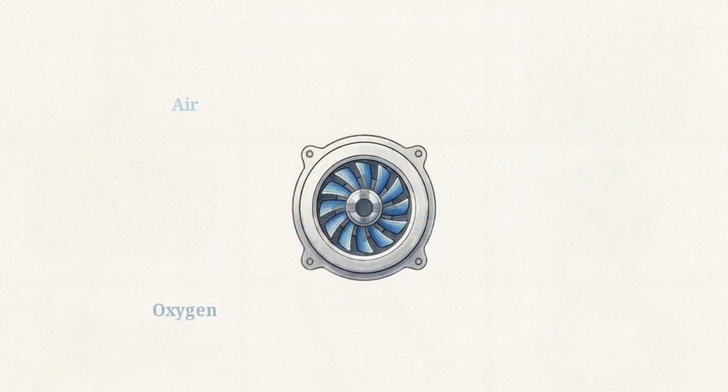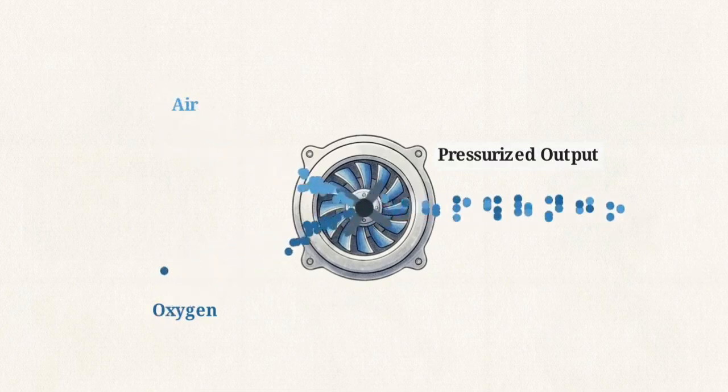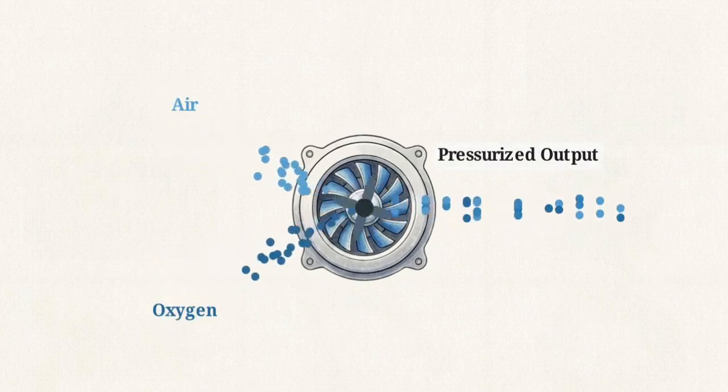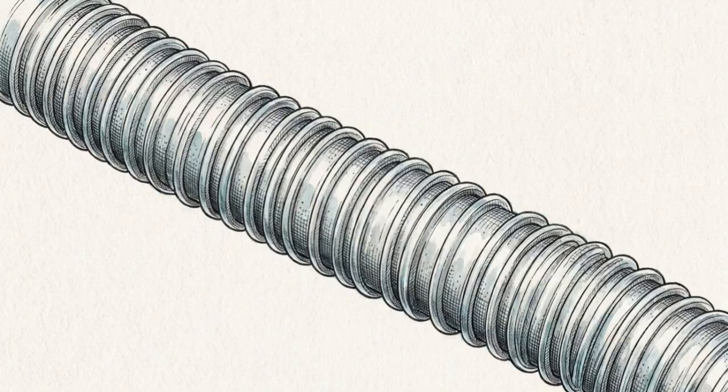This schematic cross-section shows the mechanics hidden behind the panel. High-speed turbines and gas blenders rapidly mix distinct gas streams, pushing them through valves to hit exact pressure targets. The pneumatic block serves as the system's muscle, executing the digital brain's instructions with calculated mechanical force. Leaving the central chassis, we follow the external physical pathway connecting the machine to the patient.